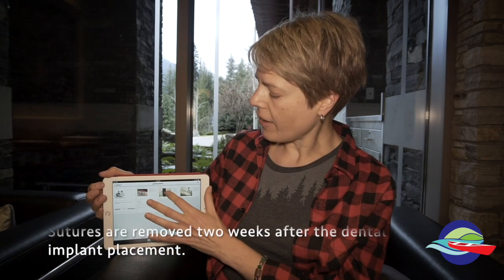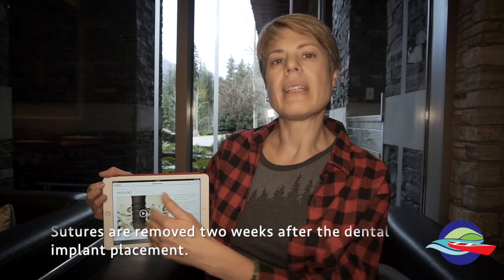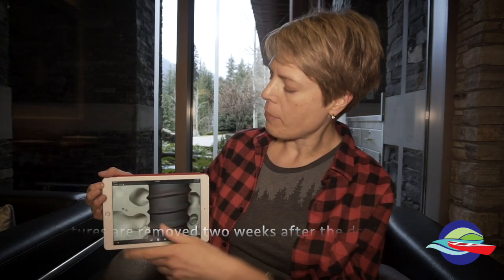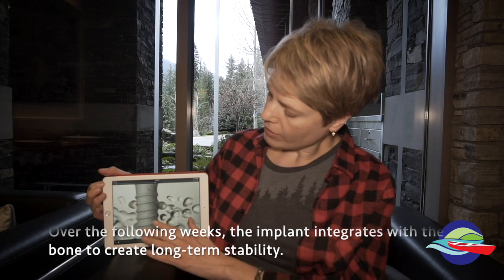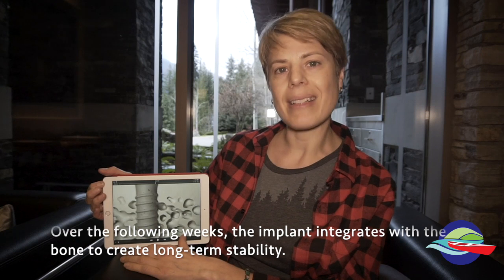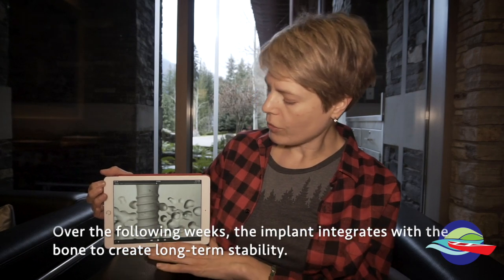Once the 2 weeks have passed, I explained to the patient that that is only the initial healing of the soft tissue. And what has to happen is the magic underneath. So the bone becomes attracted to the dental implant, and what it does is it fuses with that implant, and that's what gives it its strength. So that bone has to mesh with that titanium root, and the length of time that that takes is anywhere from 8 to 12 weeks for that to happen.